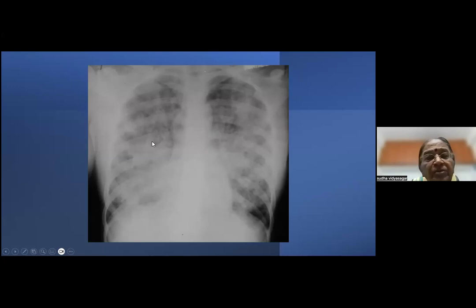See, the point is, when you see, okay, you're calling it pulmonary edema. Could be, but again, it's going far away. It's a bilateral extensive. No, there's no pneumothorax. Probably not a pneumothorax. Okay, right. There's a bilateral non-homogeneous opacities on both sides, which can be anything. Probably not pulmonary edema, doesn't look like that, but it could be some bilateral pneumonia, isn't it?